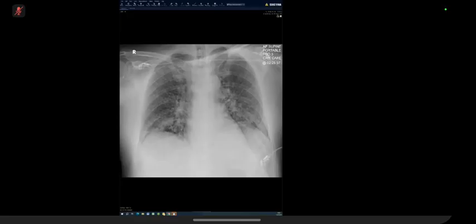Yeah. So ask the right questions now. So I will correlate with any previous radiographs, if available. Also correlate with inflammatory markers. Ask the examiner the history. You have to ask it before they offer it. Rather than say, may I have the history, you can say, I would be interested in knowing the history of the patient, and then you pause. And I would say, immunocompromised.